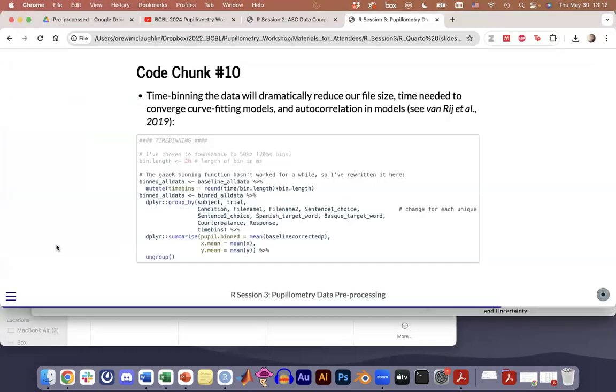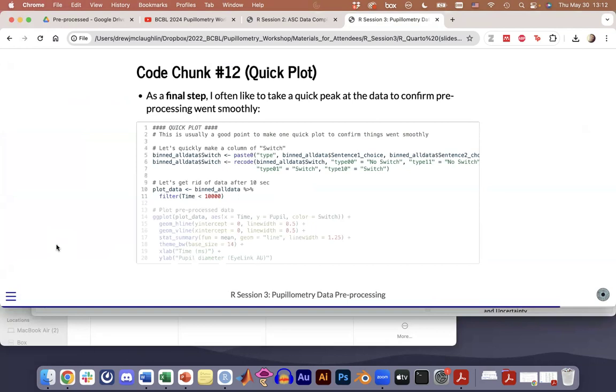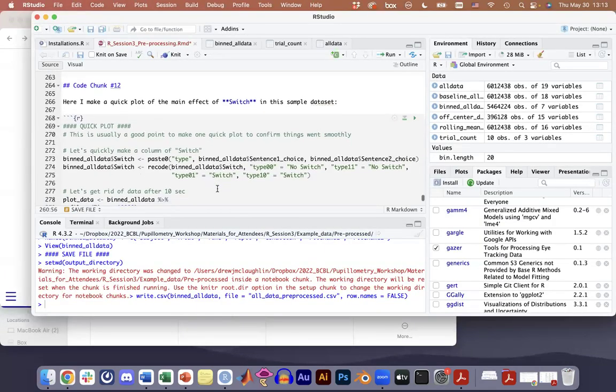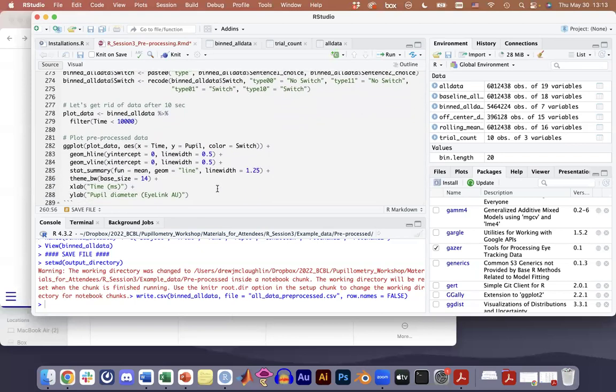And then because I would feel entirely too sad if we left this session without having seen the data. I mean, we have to look at the data. We've done all this work with our code. We should at least have the benefit of getting to see a pretty plot. So you'll see that code chunk 12 has some more code. Some of it is prep where I wanted to rename some of my columns and yada yada. And actually I dropped some of my columns, classic. This is why you don't change things on the spot.